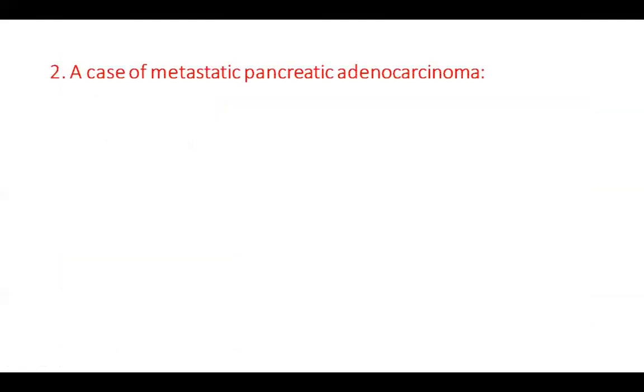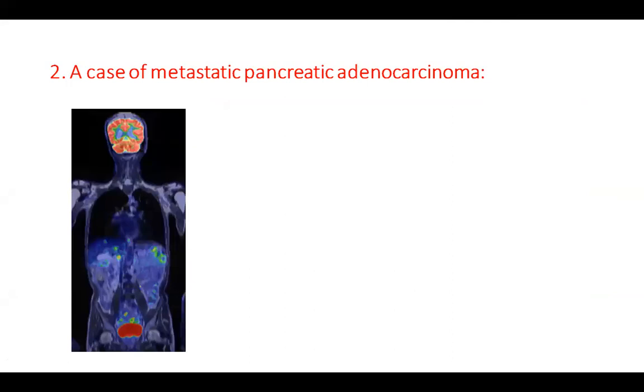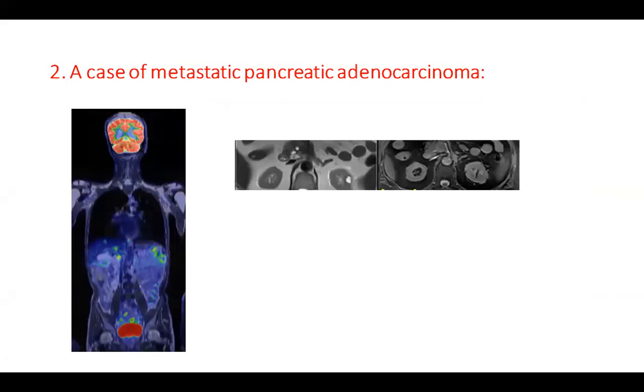This is an example of a case which showed that the patient had developed another tumor, another malignancy, after about 30 years of prior breast cancer. We have another case here of metastatic pancreatic adenocarcinoma. This is the case's fused PET MRI.